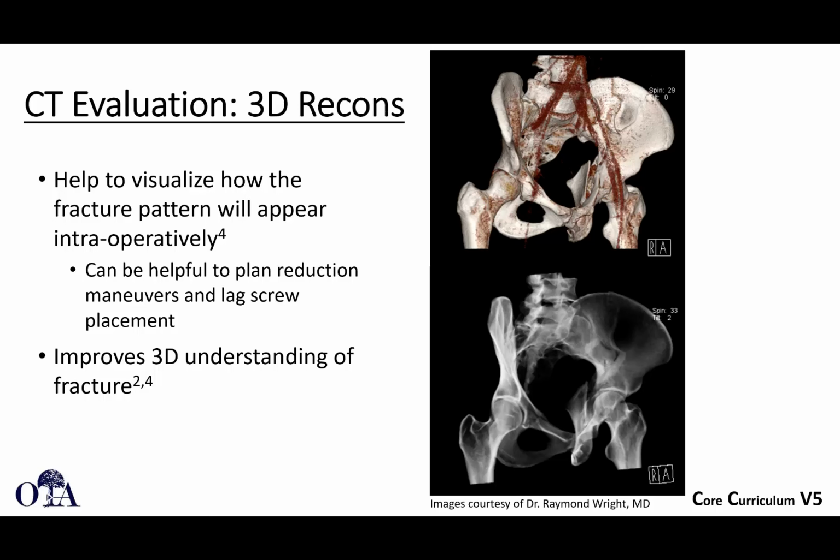Well, you can make your patient's imaging look like a model also by doing 3D recon. So this is really helpful to understand the fracture pattern and to recognize where your surgical approach is going to get you relative to what the fracture looks like. So I think these are really helpful, and whenever possible, you should utilize this if your CT scan software allows you to.